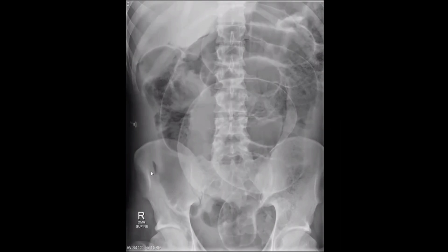And also we have the triangular gas sign and the telltale sign. So we have different signs confirming pneumoperitoneum. This case was operated on and they found small bowel loop perforation on top of Crohn's disease. This dilatation is considered ileus secondary to the perforation and pneumoperitoneum. So we don't have a mechanical obstruction, but a non-mechanical obstruction. Remember this point, because we will discuss it later on.